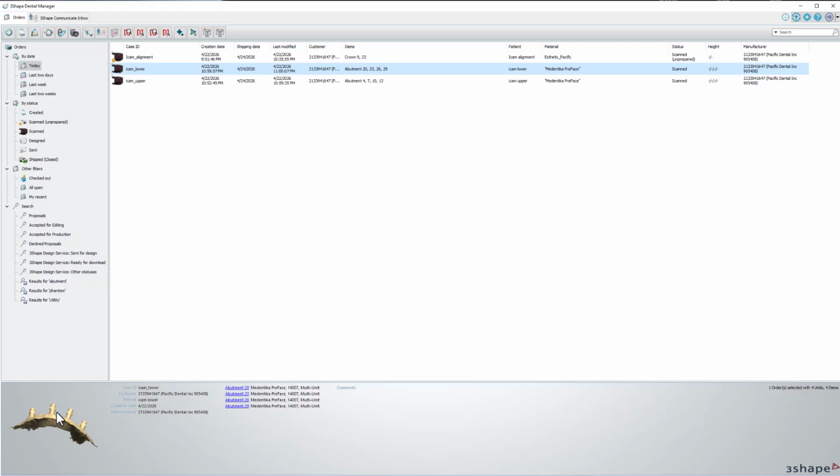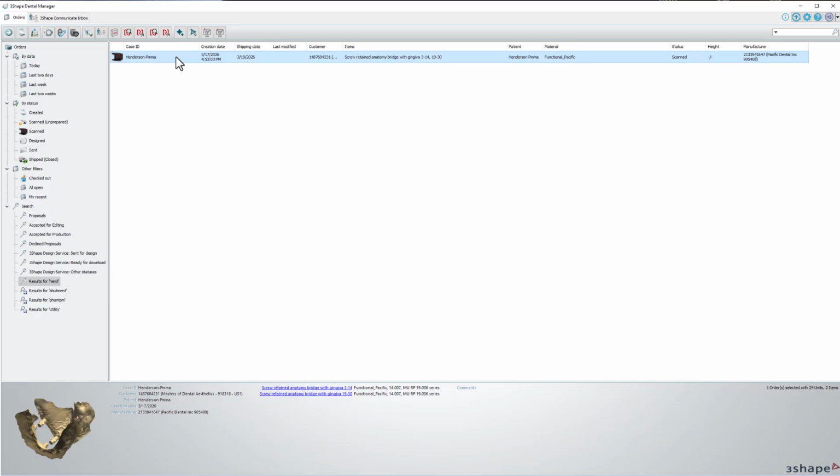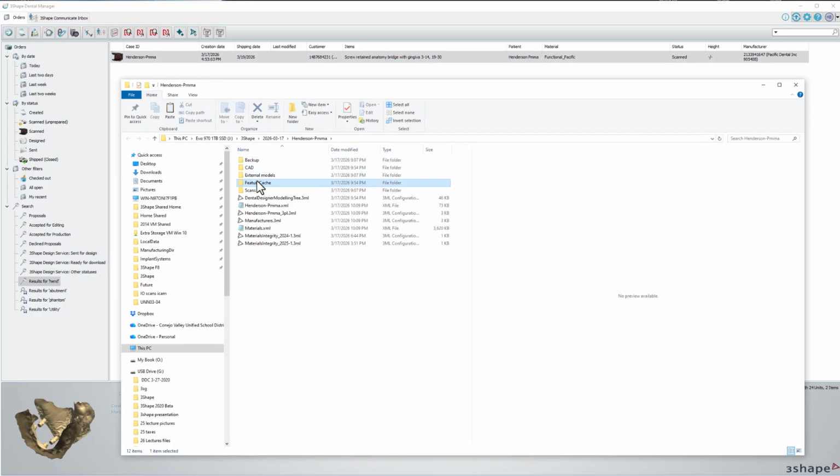Now, how do we get these two together? So for that, I actually have a case here that we started. So we're going to, I don't think this is, here, let's just get rid of all this fun stuff right here.